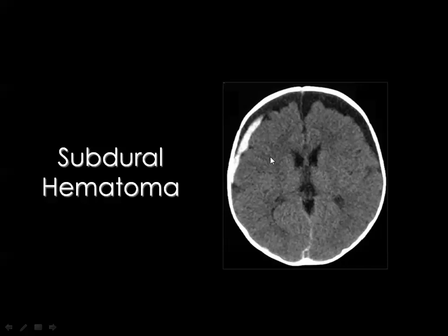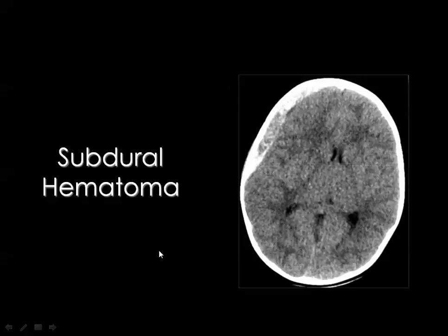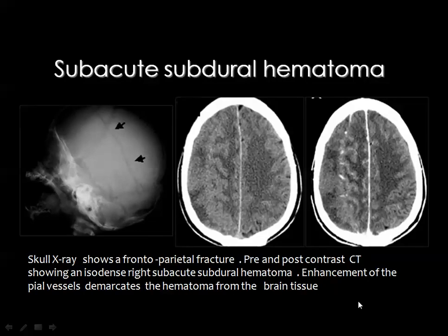And the trauma also may cause bleeding in the subdural space or in the epidural space, but here you see the subdural hygroma, CSF-like collection, and the subdural hematoma as well. And this is a good example of a subdural hemorrhage, hyperdense collection related to the inner skull table with a concave inner margin.